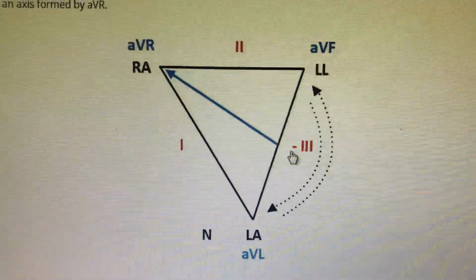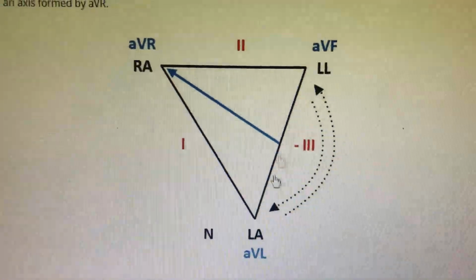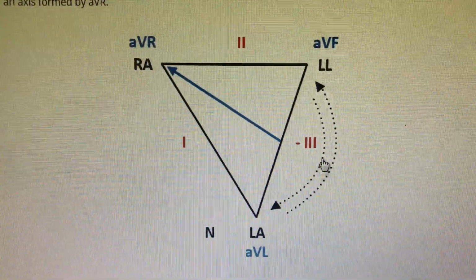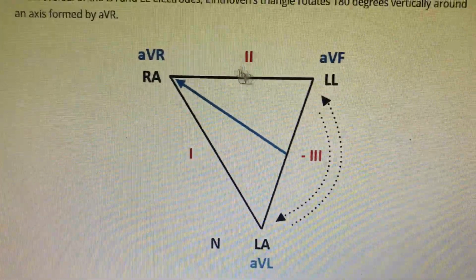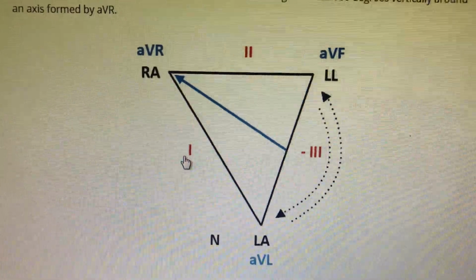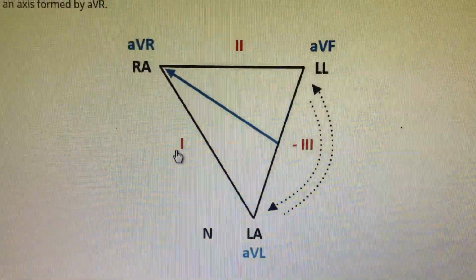Even the nurse herself knows that it is mismatched only after she has been told. But before that, it's very difficult, there is only this clue. And usually lead 2 has a prominent P wave, which becomes mismatched, so lead 1 will have the prominent P wave. That's a very soft thing to be recognized.